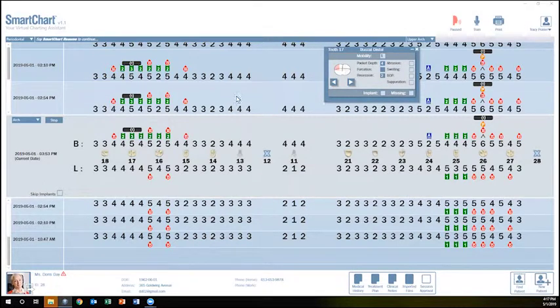Looking to the very left side of the screen, we're currently charting in arch mode. But if you have, for whatever particular reason, something you're keeping an eye on, you may want to chart an individual tooth, or you can chart in quadrant mode. So you can take a quadrant and just chart the quadrant. We've already gone through the skip implant phase, where on the lower left side we can click on skip implants and it won't chart the implants.